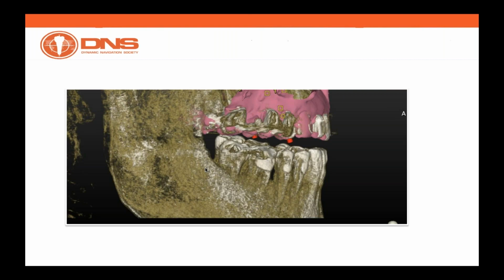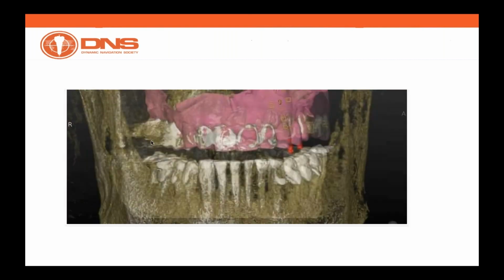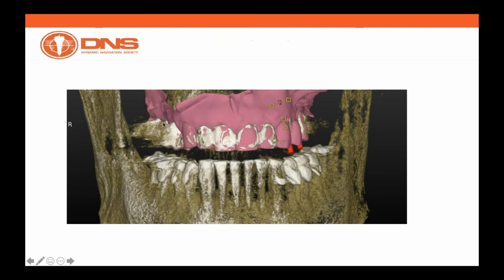prosthesis. There's metal in the prosthesis, and that metal creates and generates some artifacts. And we can see here a picture which shows a case where we can see artifact both on the right side, but also on the left side. And by the way, of course, the missing teeth are the central teeth. So in this case, performing a standard tracing, which means contouring 3 available teeth, and then allowing the software to do the matching of the 3D mesh with the 3D rendering, can be a challenge.